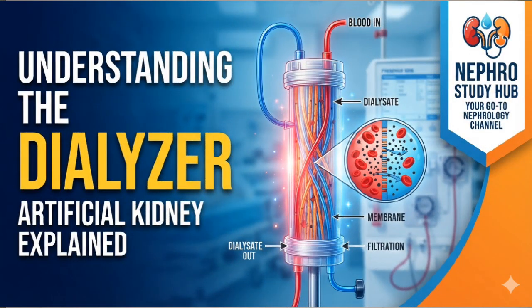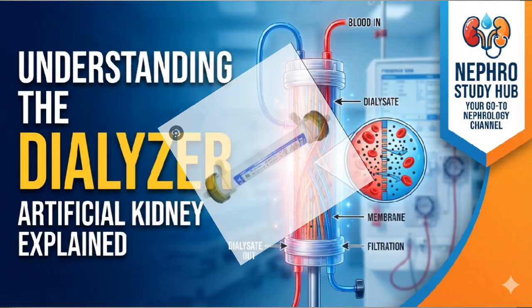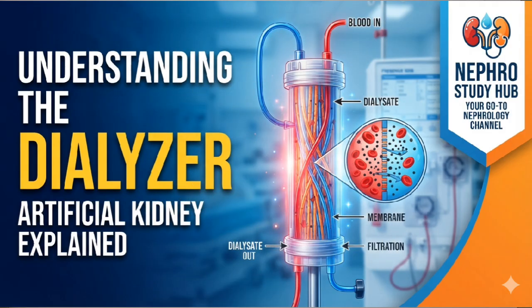Namaste to all. Today we are going to know about our dialyzer in hemodialysis. So today we are using an F6 dialyzer as an example for our class.